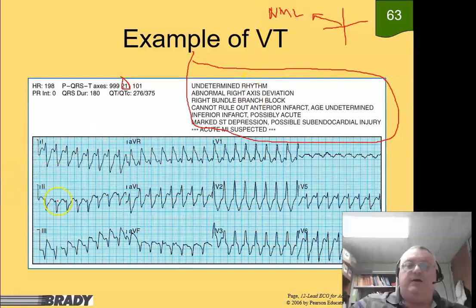Oh, well, here we go. Really simple. Down, down, down, up. Down, down, down. V1 is looking up. By the way, V1 also has the fireman's helmet. We'll learn about that here in just a second. Okay, so, long and short. Yeah, it's wide, it's fast, it's regular, and it meets that criteria. Down, down, down, up. VTAC.